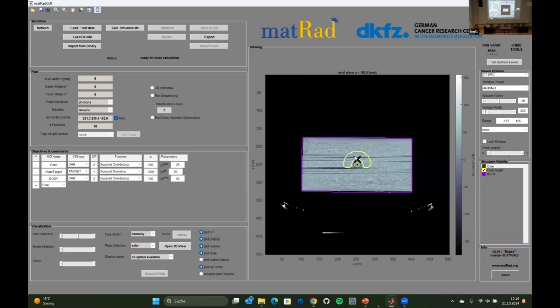These big X that you see, X marks the spot, is the isocenter. Like we heard before that basically you need to define your origin and the isocenter. The isocenter is the point of reference for your linac in a sense. It's where the rotation points to. Yeah, so everything rotates around the isocenter. Also for protons and ions, if you have a gantry, you rotate around this isocenter. If you have laser markers in the room, they will mark this isocenter. So this is basically a very, very important point of reference.